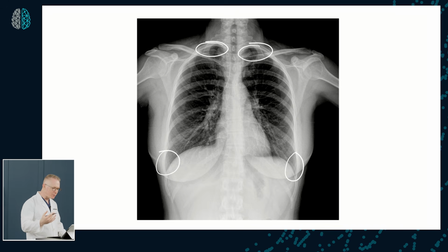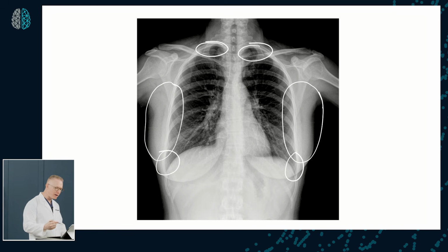Lateral borders of the ribs and soft tissue, which you can see here, are also included, so that you get adequate coverage of all the major lung fields and other parts that again are covered in the A through I mnemonic that I teach.